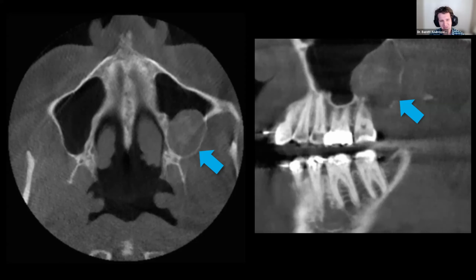Okay, so this lesion here, definitely an unexpected finding, especially when the patient was coming in just for general dental purposes, also to address that dense bone island in the front, but very, very important to catch these kinds of lesions because for this patient, they're probably not going to notice that anything is occurring way, way back in the posterior maxilla. Probably no clinical signs or symptoms at this point, and so your radiographs are really all that you have to catch this lesion. So when we're talking about pathology, again, it's very important to have all the information that we can possibly have because we don't want to miss anything.